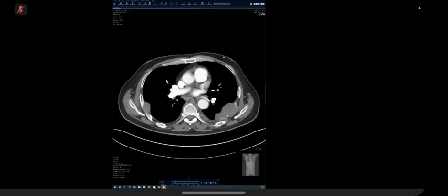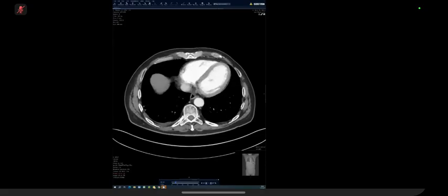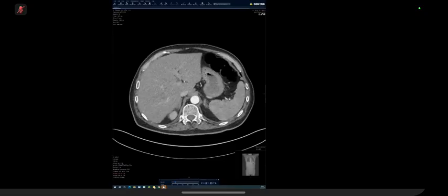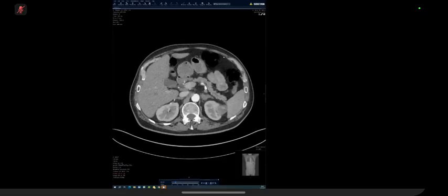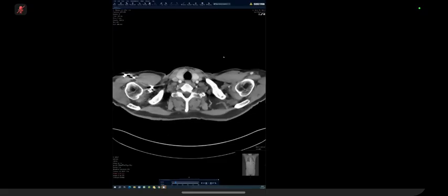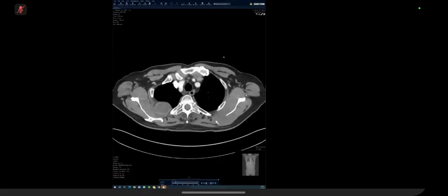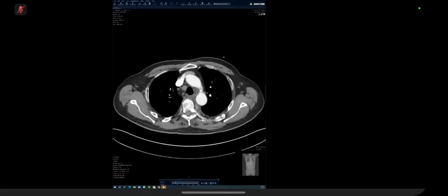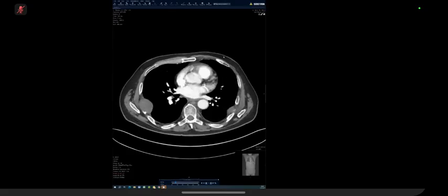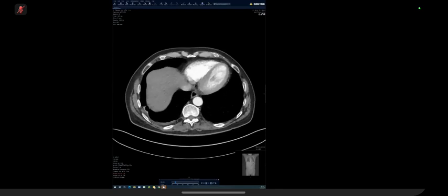Possibly, or it could be a malignancy elsewhere that has metastasized to the ribs. And actually, I'm just trying to see if there's any other abnormality that I can spot. Okay, so looking at the CT scan, there are multiple destructive bone soft tissue densities based in the rib cage with destruction of the adjacent bone, and they're more apparent. I can also see a right paraspinal mass.